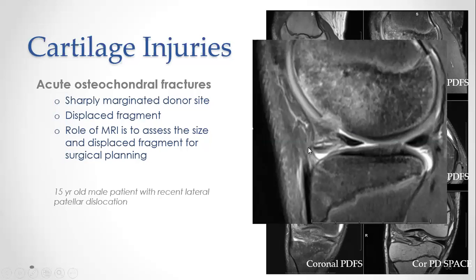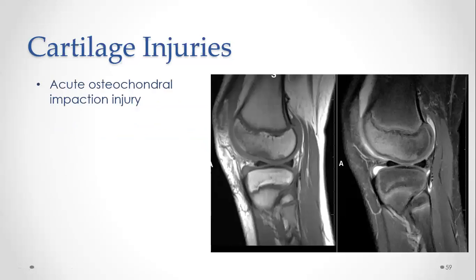We always want to identify where the fragment is. The reason for that is sometimes the surgeon could go in and reattach this fragment. Also, leaving the fragment inside the joint could cause mechanical problems such as locking of the knee.